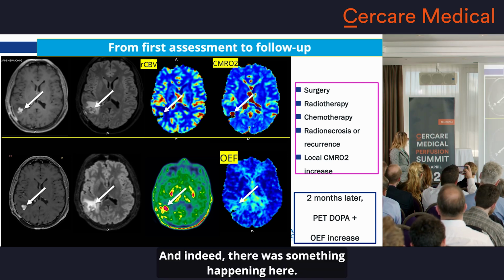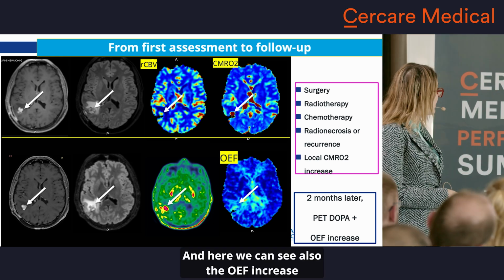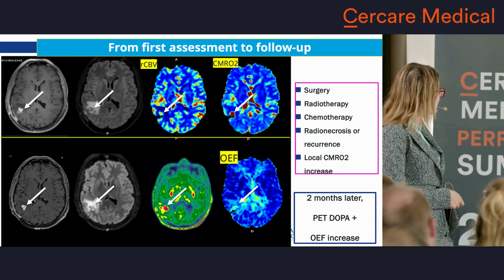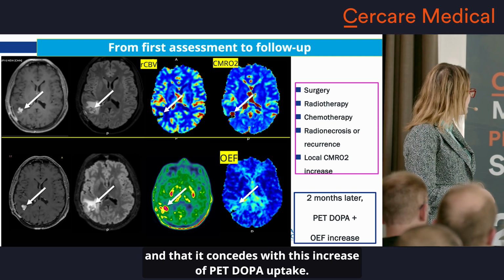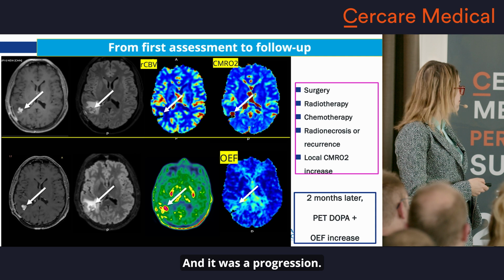And indeed, there was something happening here. He had a PET 2 months after, and here we can see also the OEF increase, and that coincides with this increase of PET DOPA uptake, and it was a progression.